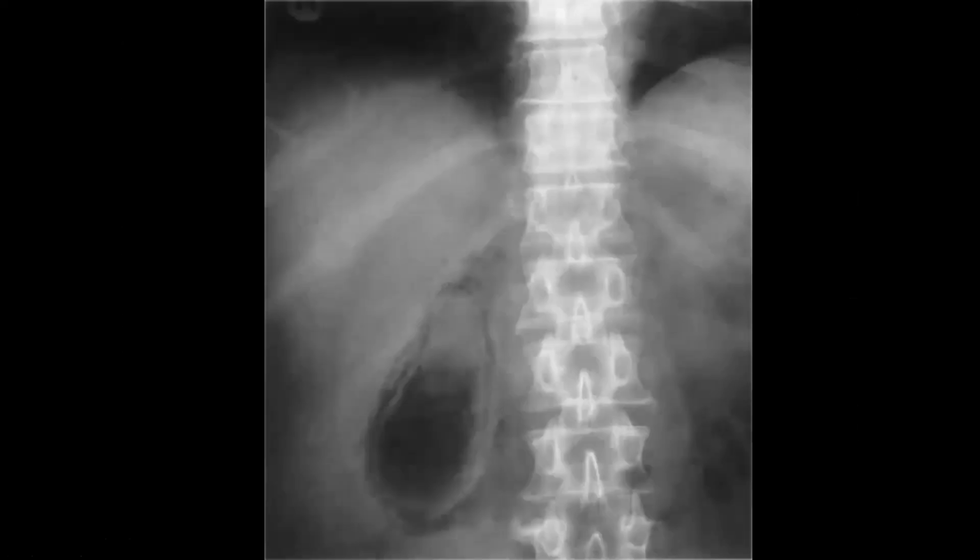One of the complications of acute cholecystitis is emphysematous cholecystitis. Here's an X-ray. You can see very clearly a pear-shaped gas-containing structure, the gas in the wall and gas in the lumen of the gallbladder, indicating emphysematous cholecystitis. As you know, this usually happens in immunocompromised patients, and it is usually a very severe infection. If you see gas just in the lumen without gas in the wall of the gallbladder, this could be a part of pneumobilia, which can be seen after ERCP or when there's a fistula with the duodenum. So not every gas in the lumen of the gallbladder is emphysematous cholecystitis. You need to have gas in the wall as well to call it emphysematous cholecystitis.